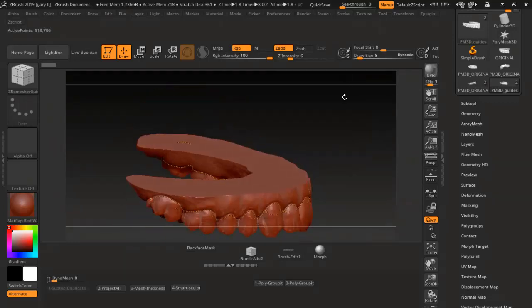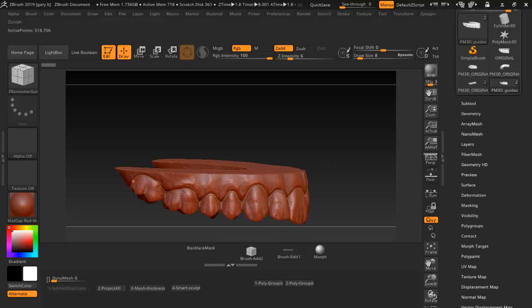So these dental sheets, they're pretty safe, so don't go sticking something in your mouth you're not supposed to. Alright, with that said, we're now going to step 2. We already got these lines out here, and it's very important not to go to step 2 right away.